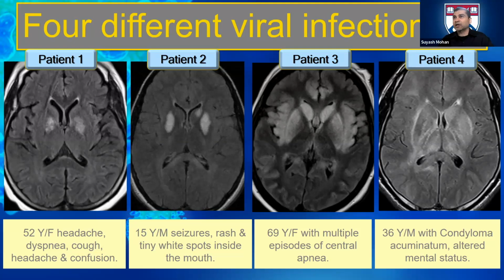And guess what? One of these 4 patients actually had COVID. She was scanned during the peak of COVID, the very first time we did an MRI scan for a COVID positive patient. This was a few years ago. So I'll discuss those findings also.